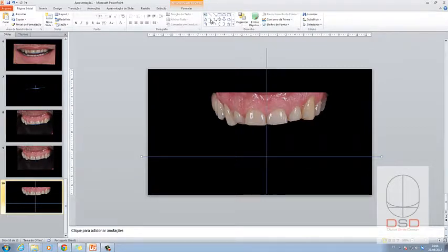the smile. The first thing I'm gonna do is I'm gonna draw a curve, which is this command here, and basically I'm going to look to the posterior area, and I can see that this side is a little bit better, so I can create somehow a line, a curve.